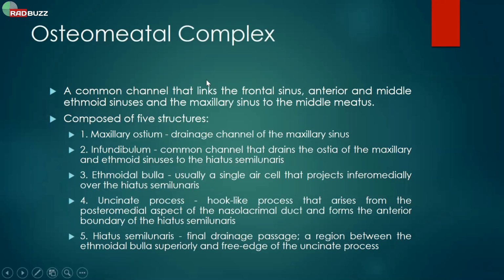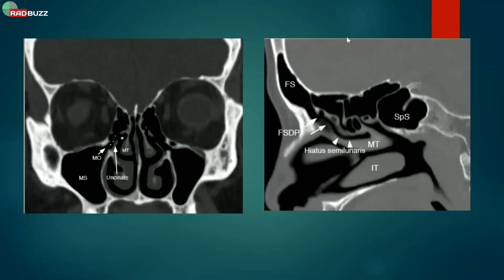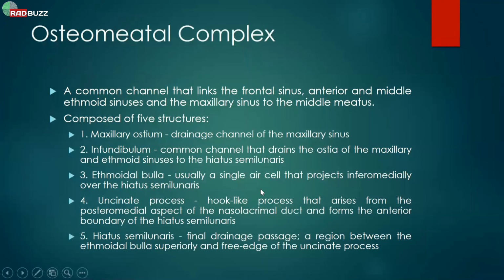Now, the report of paranasal sinuses FESS protocol is incomplete unless you comment on the osteomeatal complex.